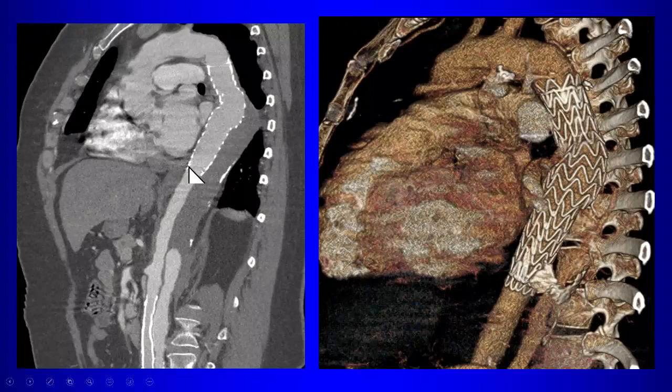So this patient is treated with a stent, and then you can see already what's happening here is there's some thrombus that forms within the false lumen, and the stent helps to maintain patency of the true lumen. Now, what can maintain patency of the false lumen? Well, if you close the entry tear, right, then you're closing that communication between the true and the false lumen. But often there can be other fenestrations distally along the dissection flap. And where those openings are, where those fenestrations are, they can also lead to patency of the false lumen.